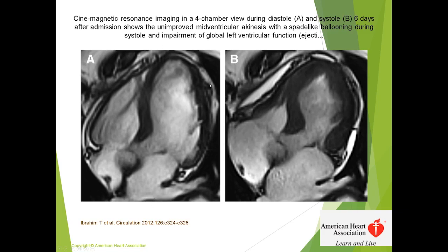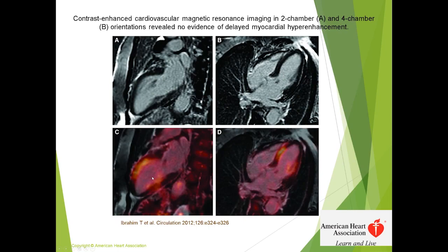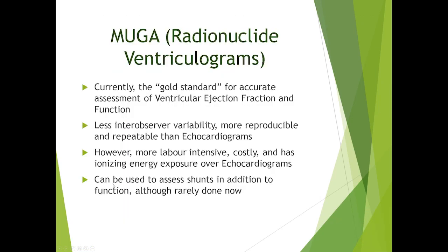Here's a situation where you have an MR image in the end-diastolic and systolic volume, where you see that the muscle seems to be in good shape, but it doesn't seem to be contracting properly. And when you look at the metabolic component, again, you see that the metabolism is altered in the apical region, whereas the rest of the myocardium seems to be fine. And again, as I mentioned earlier, looking at this in a multimodality fashion really helps us understand some of these disorders better, and what may be going on physiologically, metabolically, and perfusion-wise in these disease states.